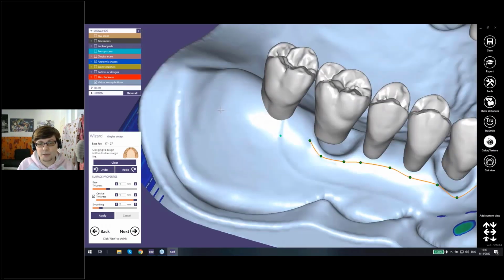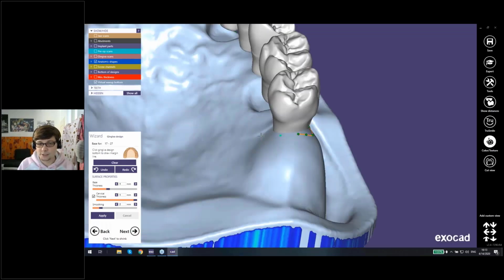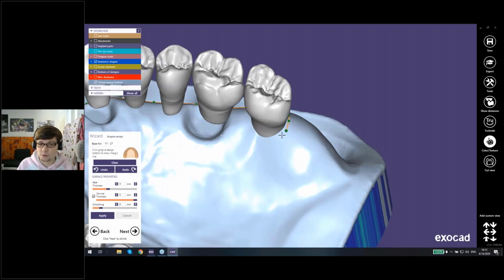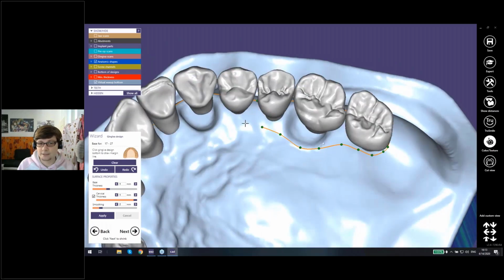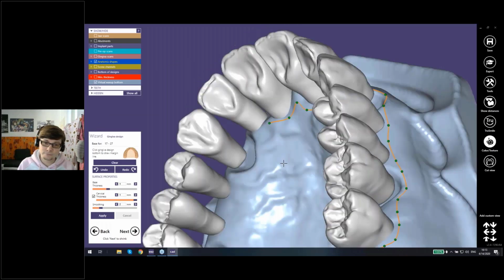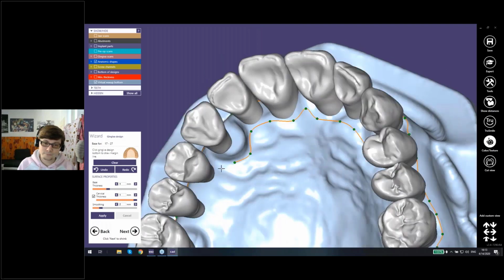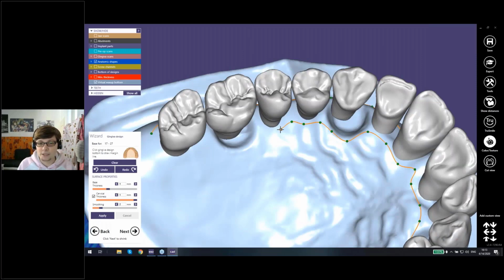So I'm going really close by the teeth, but it's important to draw the line kind of around the teeth, so the software knows that these teeth will be included for your gingiva design. Because you can also design a gingiva that doesn't include all of the teeth. You could design a gingiva only for the anteriors if you wanted to. And even if I'm not happy with the gingiva design in the end, when I'm getting my merged bridge design, I can still change everything with freeforming.